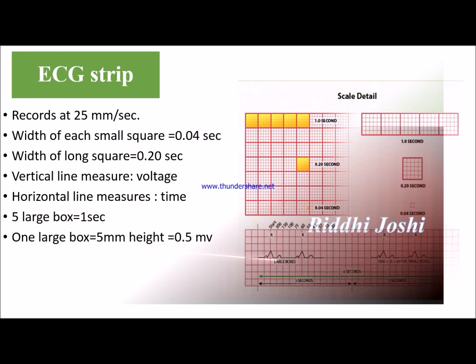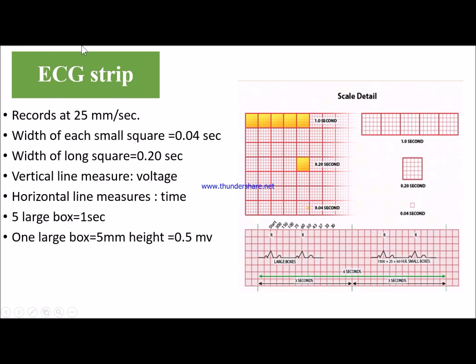First of all, we need to know about the ECG strip. If we know about the ECG strip, then only we can say to anyone that okay, you are having this problem. If we don't know about it, we cannot explain to anyone else. So first we need to know about the ECG strip.